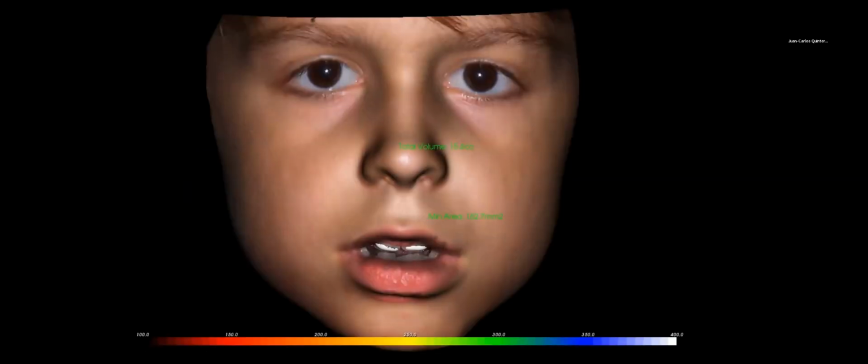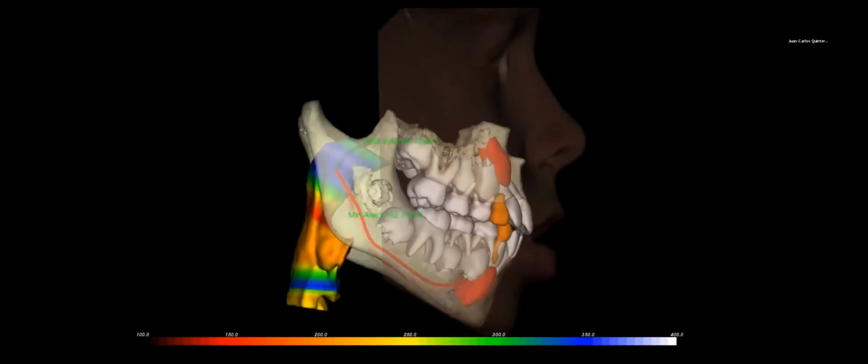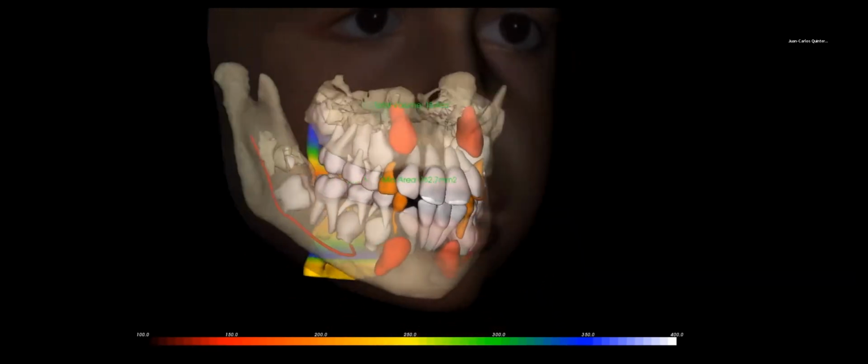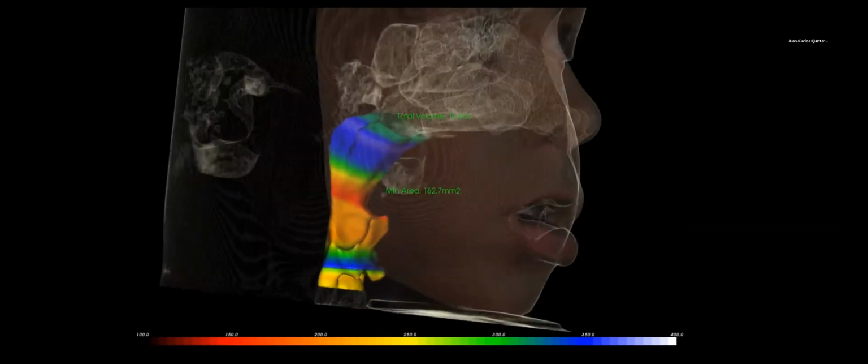Then they'll add the bones. And this is what you get. This is our one and only diagnostic file in our practice for our patients. So you can do videos.